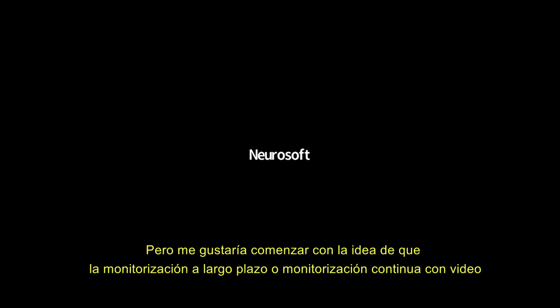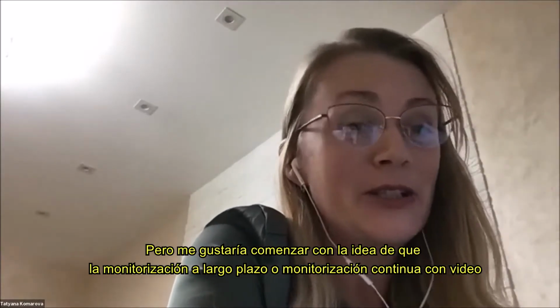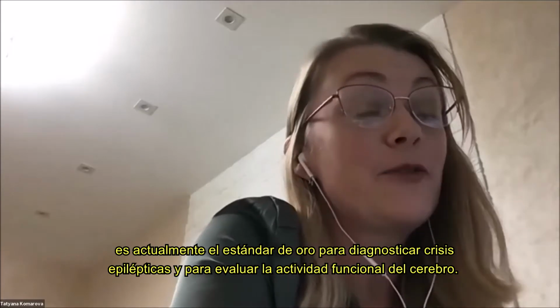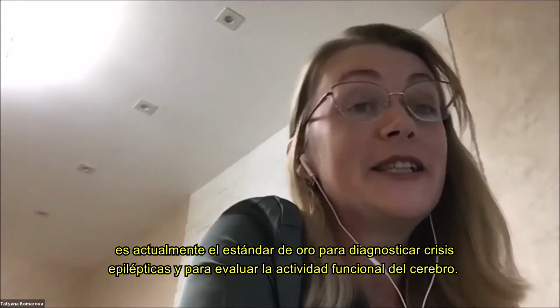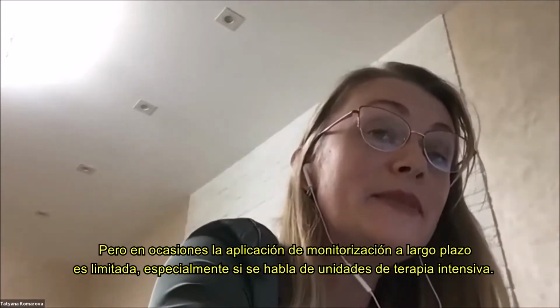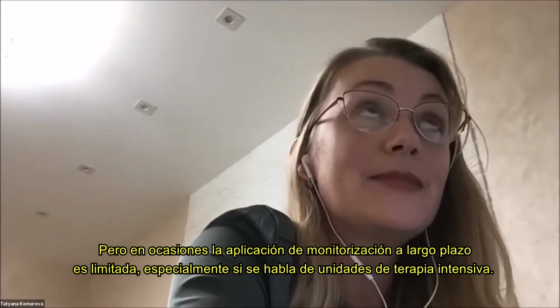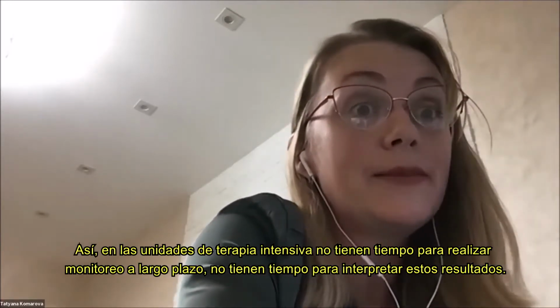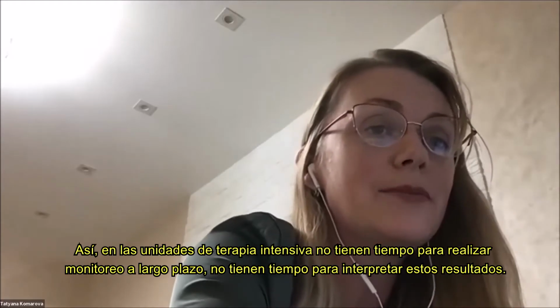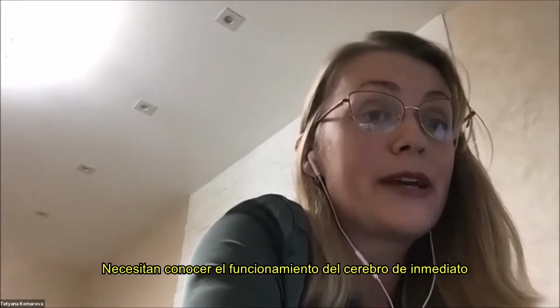But I'd like to start with the idea that long-term continuous video EEG monitoring is now the gold standard for diagnosing epilepsy and seizures and for assessing the functional activity of the brain. But sometimes the application of long-term monitoring is limited, especially in intensive care units. In intensive care, they have no time to perform long-term monitoring or to interpret the result. They need to know about brain function right now, at this moment.